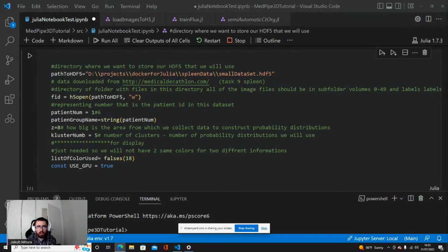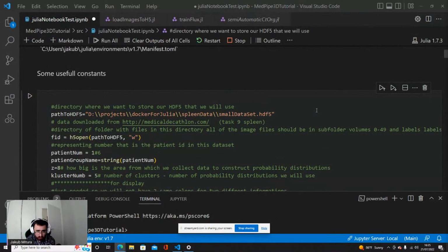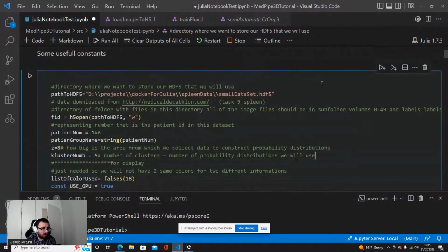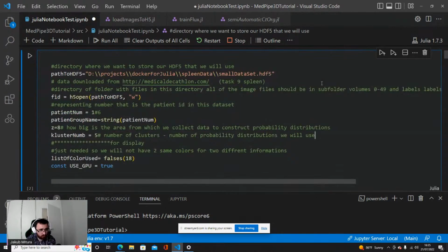Is it possible to run this in an online REPL? Yes. Basically, I use the normal REPL of Julia. To be honest, it works a bit better in REPL than in Python in the Jupyter notebook. When I'm working day to day, I do not use Jupyter notebooks. This is just easier to show during workshops what is happening and where exactly we are. But usually I just execute parts of the code in the terminal. Each REPL should be okay.